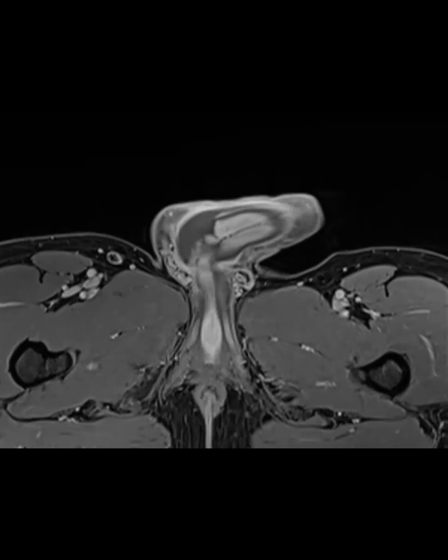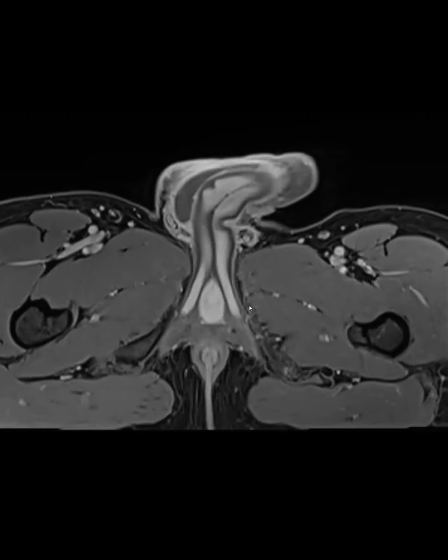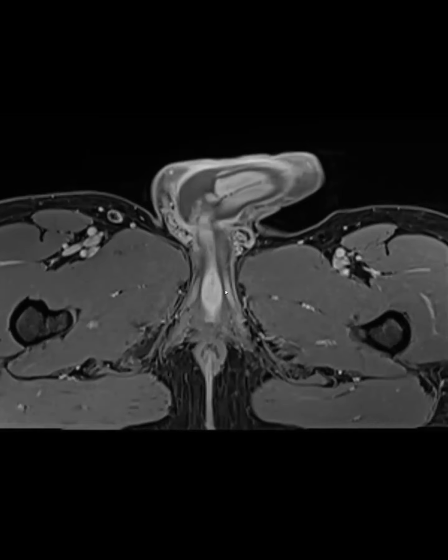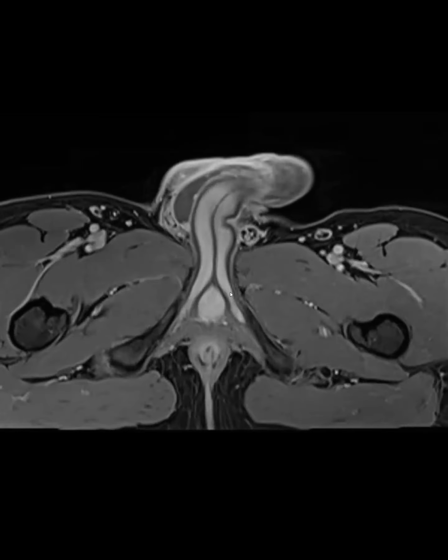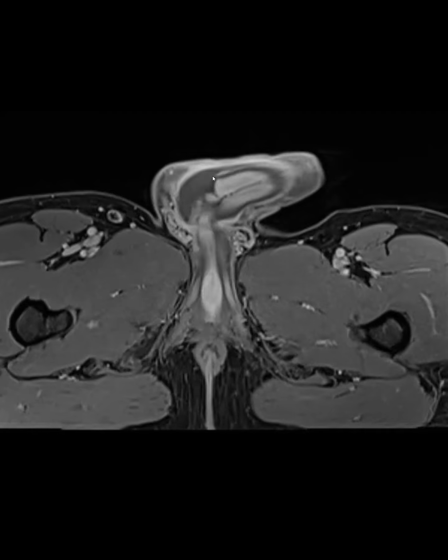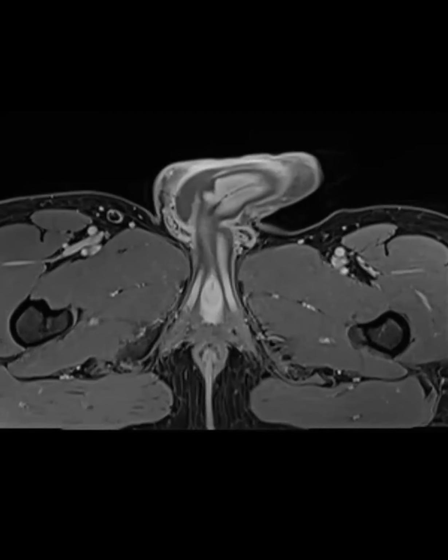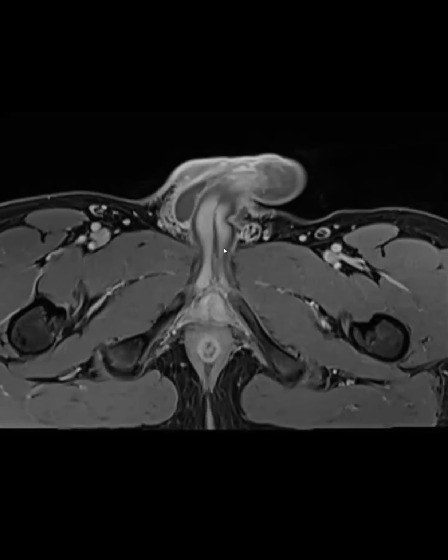Okay, so looking at this on the patient's right side, I don't know if you can see what I'm pointing at. There's this defect, sort of lateral, transverse, wedge shaped, going through the actual soft tissue of the penis with this supposed hematoma or fluid collection just lateral to that. So, all things considered, the concern is for a penile rupture or a broken, fractured penis. Yeah, exactly.